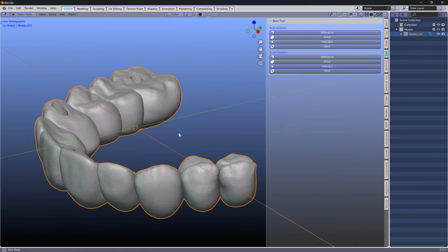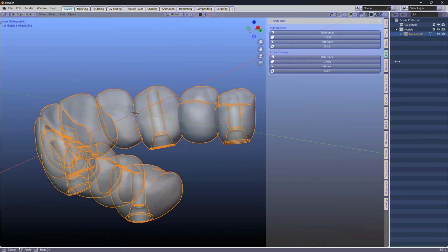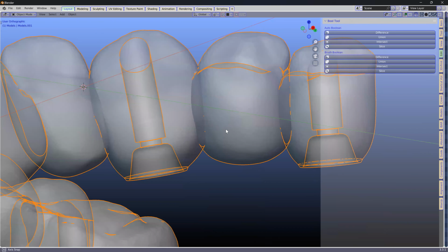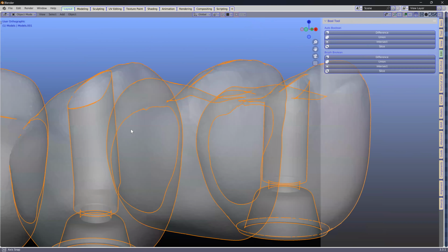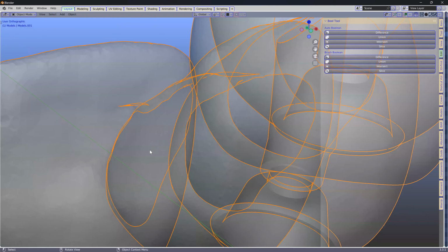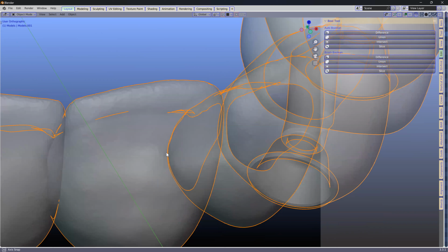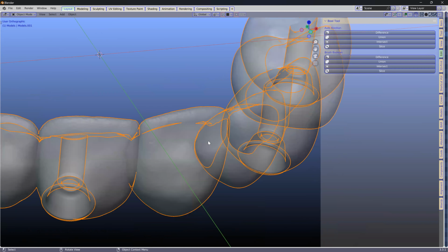Now I've got to assess whether I've got enough space for a bar. I'll go back to transparent mode, because when I say space, we need sufficient space on the inside. For example, if you have a look at this opening here, how are you going to put a bar in?